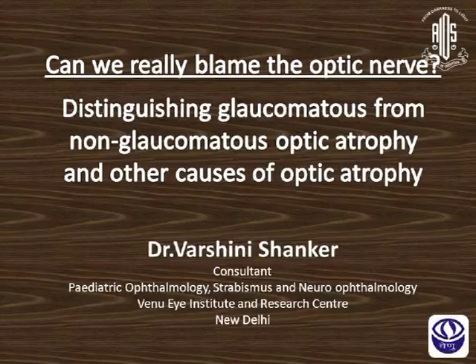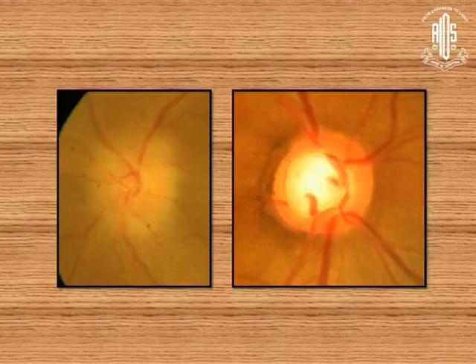Good morning, everybody. As previously mentioned, a lot of the topics which we are discussing overlap, but this time I'm going to be looking at it from the other angle, and we are not discussing pallor, but we are discussing the cupped pale disc. So, if every disc pallor looked like this, and if every glaucomatous disc looked like this, then we wouldn't be having this presentation at all.